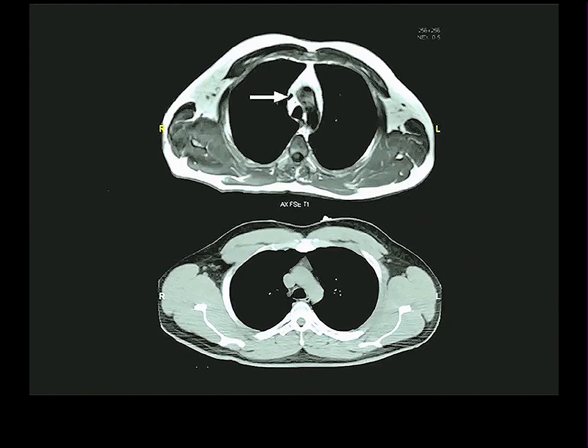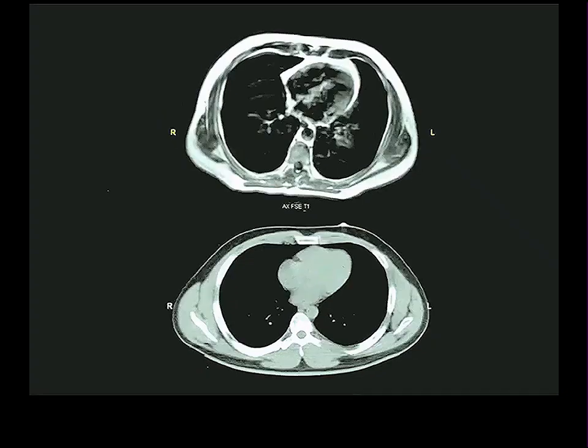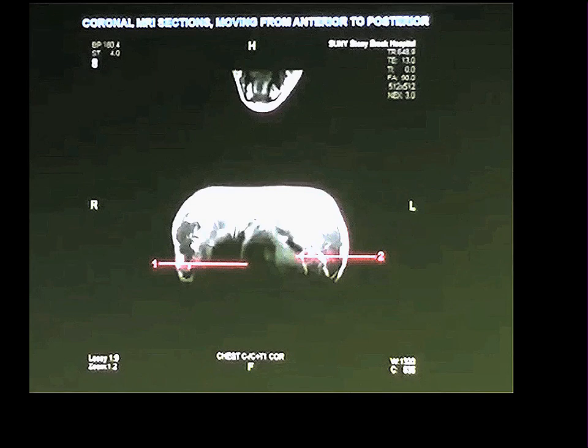Look how funny the superior vena cava looks in this person. Just looks flat. It depends. Sometimes there's a lot of blood flowing through it, sometimes not so much at any moment in time. But all the other things look the same: trachea, esophagus, aortic arch, pulmonary trunk bifurcation, everything. You can go through this yourself. So, now, and again, I don't have time, and wouldn't have done it even if I had time.